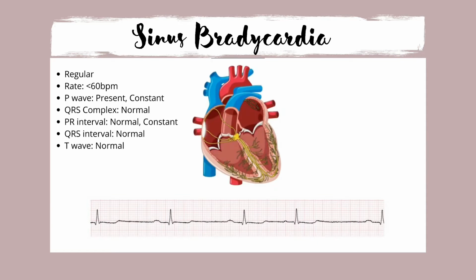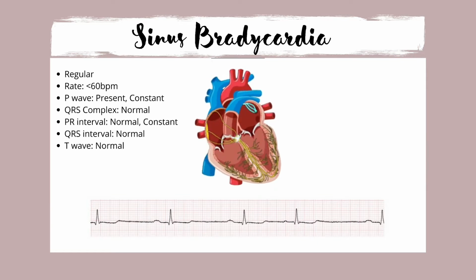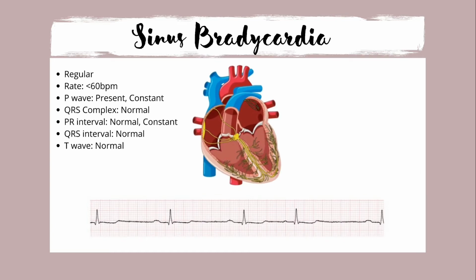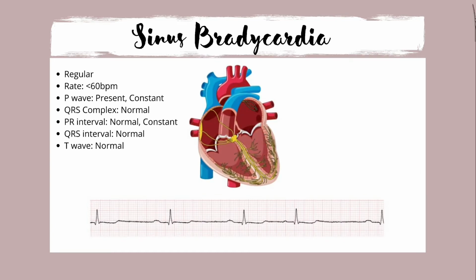Patients are usually asymptomatic and no treatment is required. Often caused by beta blockers and calcium channel blockers. May also be seen in athletes and occur during sleep.